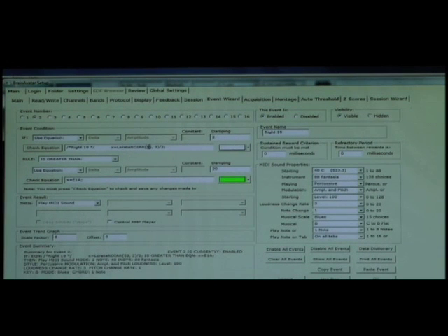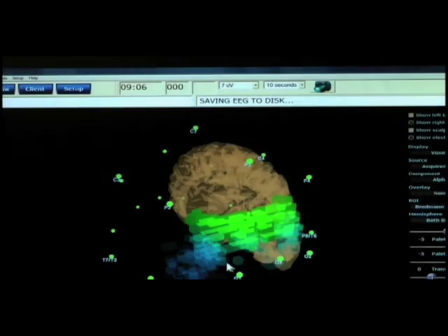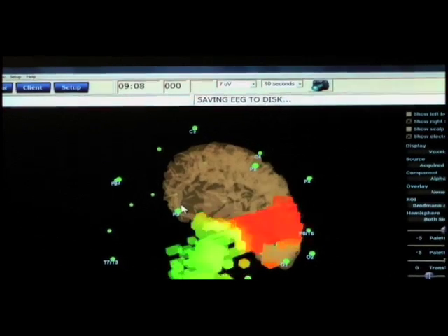Here it's now 19, area 19. So those are all we need in order to request the LORETA region of interest amplitude data, in this case left or right hand side. So I'm going to use these settings and exit, and the settings are now in use.